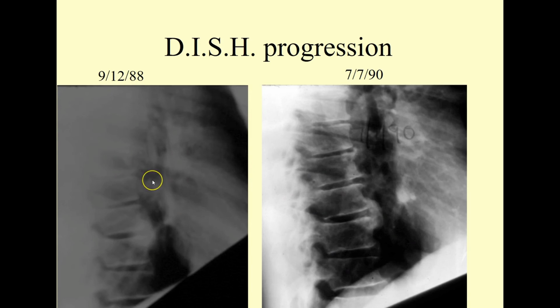This is the earliest radiograph, and it was part of a chest film. And concern was raised with regard to what was interpreted at the time as a large solitary pulmonary nodule. Subsequent exams yielded that it was not an issue. It comes back, and I actually have films every year, 88, 89, 90, the annual event. I just skipped years to still carry the story.